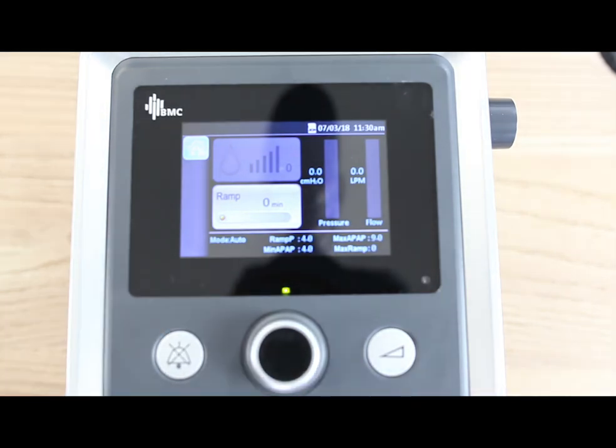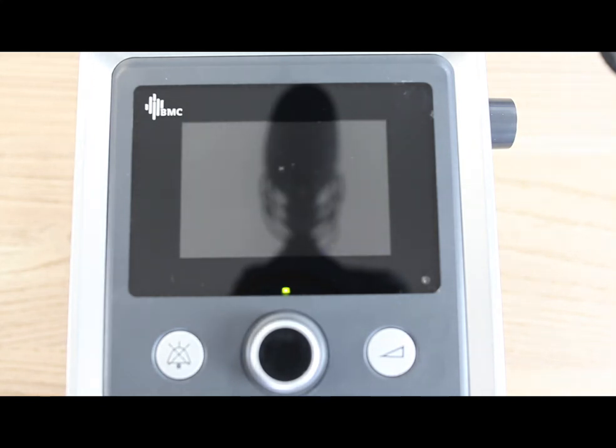Note to take out of this is that if we look at our data on a weekly basis, we can have a look at those data variables and use them to configure the min and max APAP to make it more comfortable. And then once you have gone and set that, we can then monitor it day by day after if you'd like, and just make sure that your apnea-hypopnea index is still really well controlled. You can continue to bring that max APAP level down as long as that AHI is under 5.